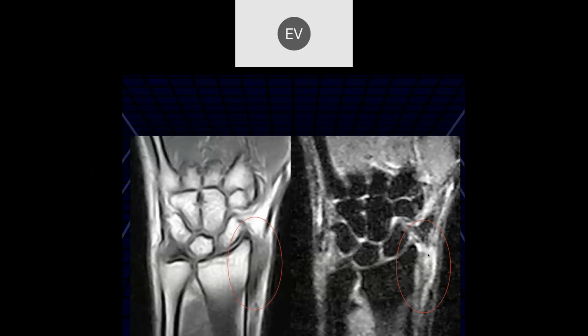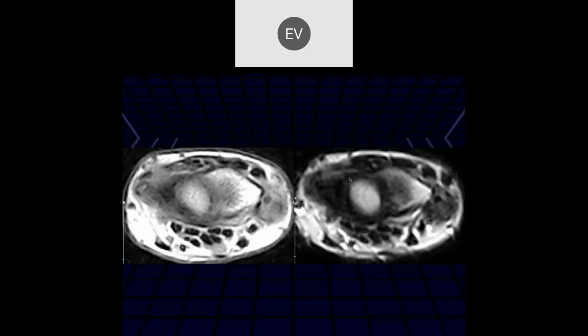Be worried about tendinosis. And then here it's hard to even see the tendons, maybe one right here, but still abnormal signal intensity within it. A lot of synovial thickening in the tendon compatible with chronic tenosynovitis. In this case, we don't see a lot of fluid, but a lot of synovial thickening. And this was a patient with de Quervain syndrome.